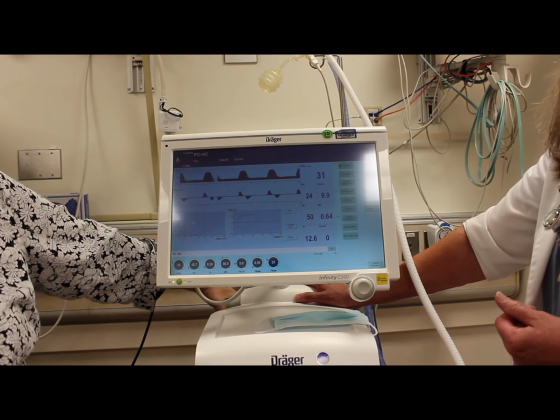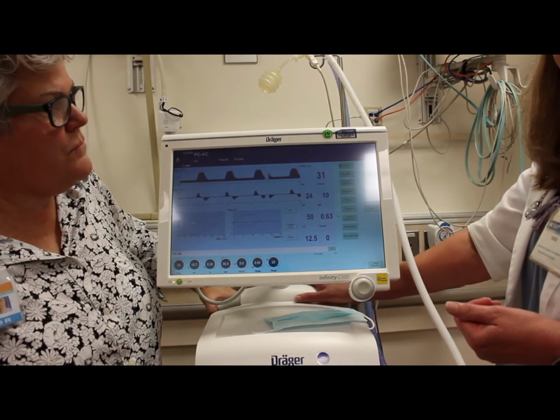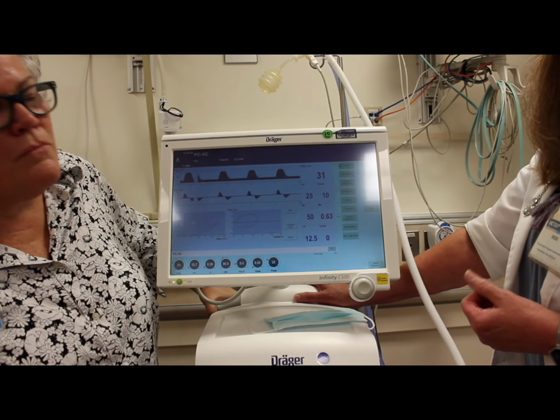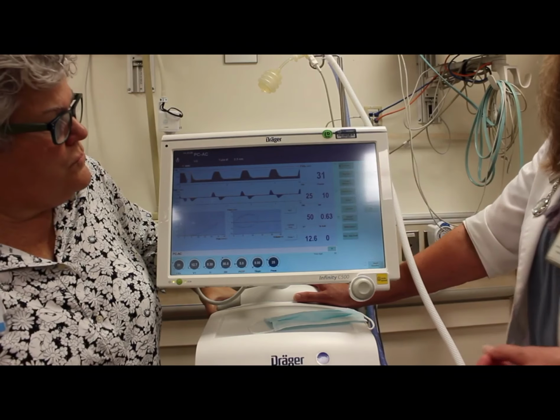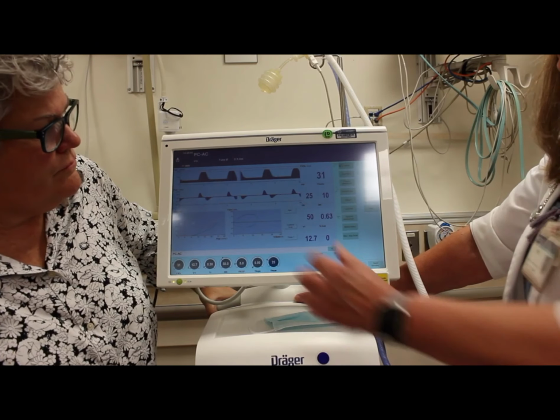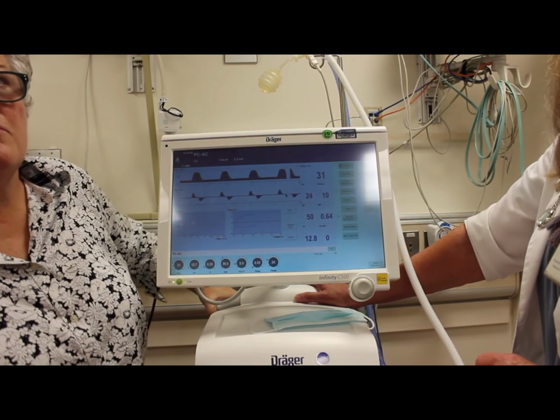If you see them do it, they actually have to take it out of the circuit and calibrate it off the baby and then put it back in. We also tend to get a lot of water rain out in our circuits, and that will also mess up the flow sensor. And when you take the baby off for something and you see water and shake it out, it might also ask us to calibrate it. So anytime there's any kind of flow sensor message, you need to call respiratory. The most serious ones, you'll see a red line across the screen here. The minor ones, you'll see a yellow line. But you should call us for major and minor ones.